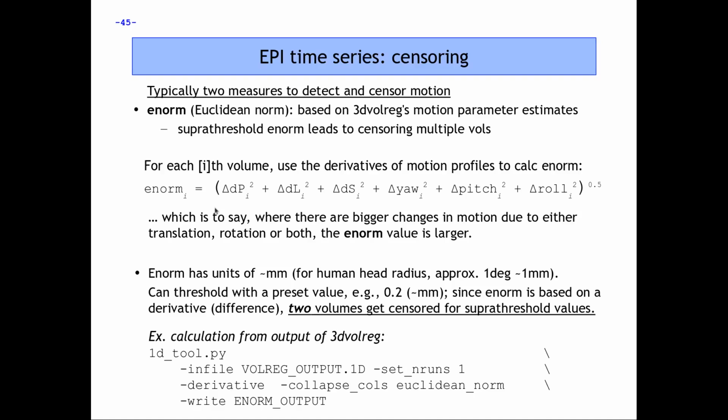It's a nice parameter to have. The units of it are what we call kind of millimeters in parentheses, or something like millimeters. If you notice, we've put in this equation that we're adding together things of millimeters squared and degrees squared, which looks like a poorly constructed formula.